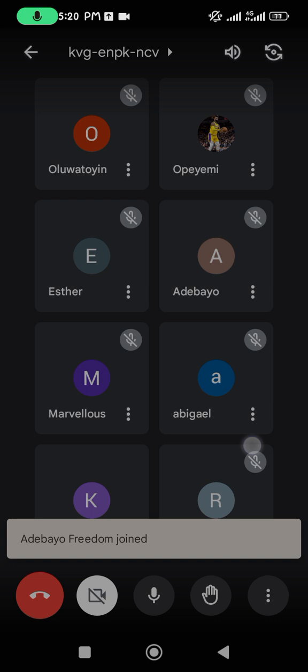So I was saying that the P wave is negative in AVR, right? I already explained that before, but it is biphasic in V1. And then I showed you that image as an example of the P wave being biphasic in V1. Did you see it up to that place? Yes, I did. So now, that W and M, I'm telling you that there's also an abnormality, where on your strip you can see something like a W or an M, but it is usually on the QRS.